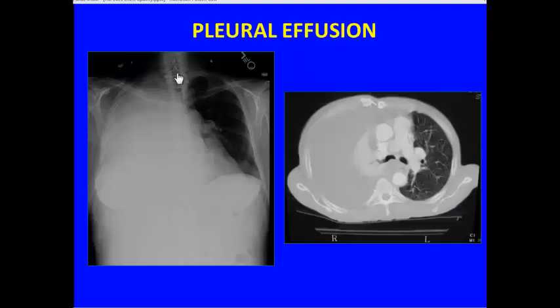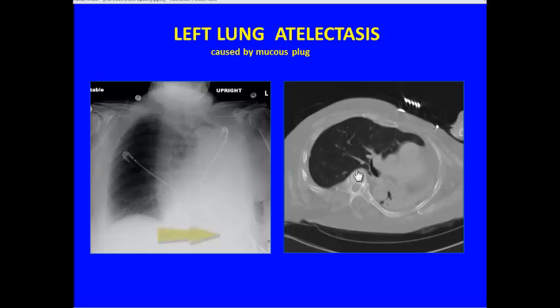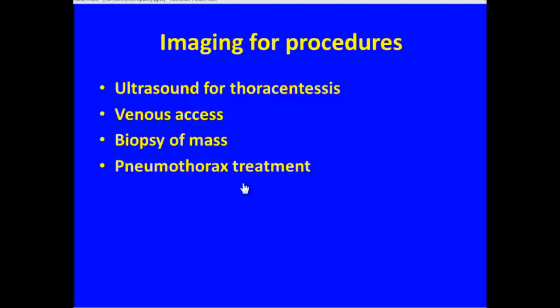Our friend here, if we look at this, we can see here's the trachea right here, and here's the carina, and it's being shifted away from the opacified side. So that's a big mass, and we can see this is a huge pleural effusion filling up that right hemithorax, and there's that collapsed right lung, and all that mediastinum is being shifted away. So if we see the mediastinum shifted away from an opacified hemithorax, we're thinking about pleural fluid or mass, and that needs a thoracostomy tube typically. And if it's shifted towards the opacified side, like our friend over here, we're going to think about bronchoscopy.